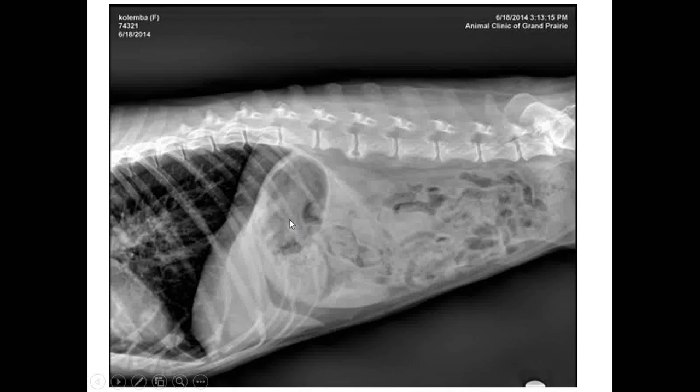Spondylosis, this bridging, this calcification of the ventral longitudinal ligament. I've had veterinarians and neurologists tell me this causes no neurological problems. I disagree. I think it does. This is almost like a lumbosacral problem going on back here. You see the bridging here going on in this radiograph.